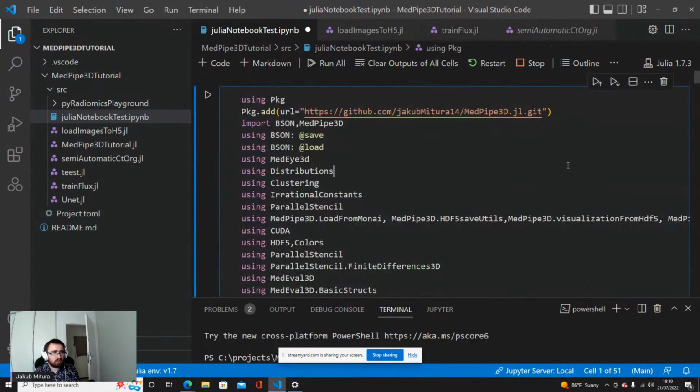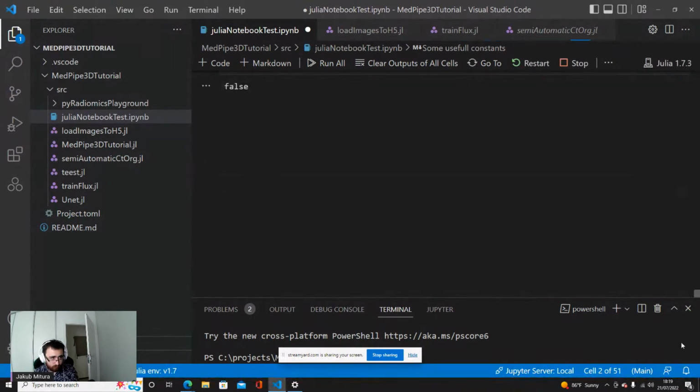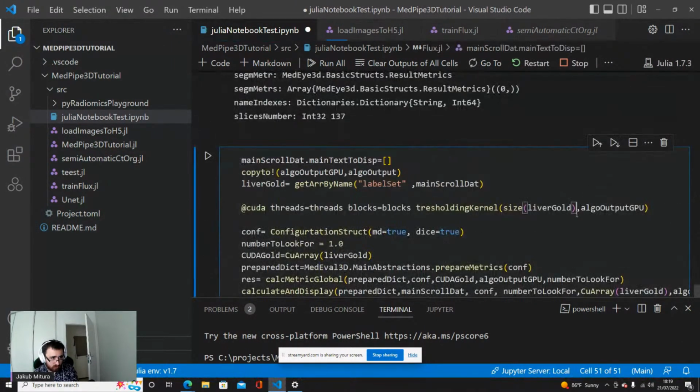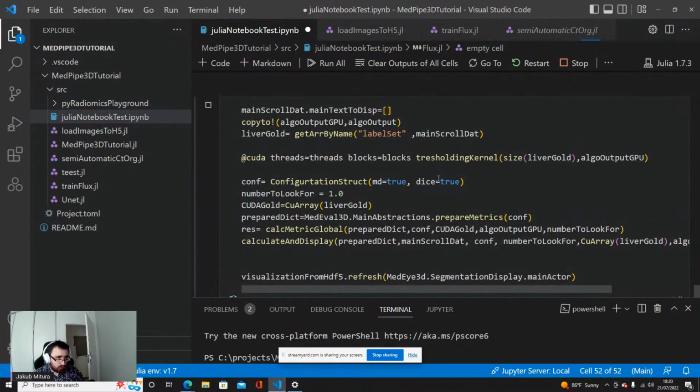And now, just as a spoiler, I will show you on the spleen dataset. This is the performance on the spleen dataset. What would be the output of the neural network? So now we'll get to a different part, where I will describe how one can perform some simple training on a very simple neural network to get a segmentation output.